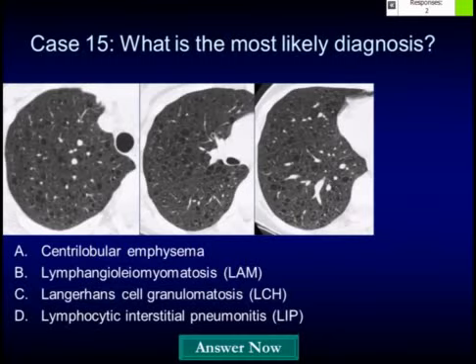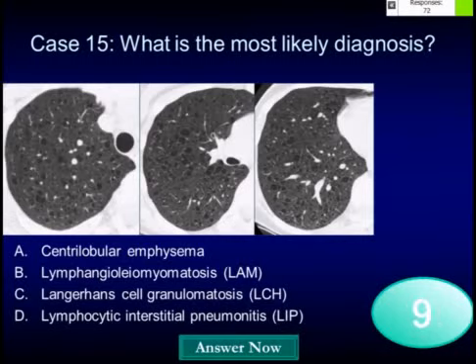How about this case? Think about the wall of the cyst.